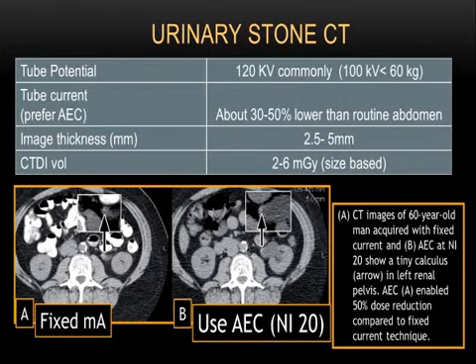You have to use automatic exposure control technique. Most studies point out that 120 kV is ideal, and the reason is that 100 kV can give you problems in the pelvis, where the different artifacts and increased noise can be troublesome. If you want to go to lower kV for that, I would suggest that you use a much lower threshold than what you use in the chest, for example, 60 kilogram.